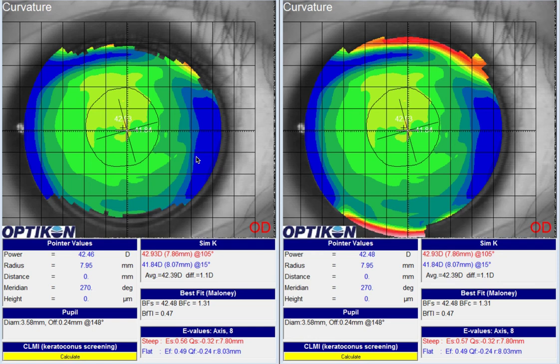In this orthokeratology case, we're troubleshooting a patient whose lens is not centering very well, and there's also some undercorrection after lens wear. I think one of the problems is we have some artifacts in the baseline topography, and when I took another look at the lens, it looks like this is being transferred over into the design. So there are two ways to go about it. One is you can just erase these areas, kind of like I've done here.